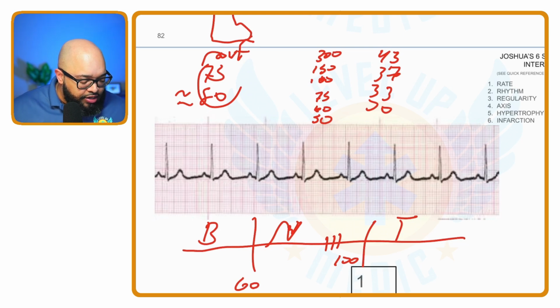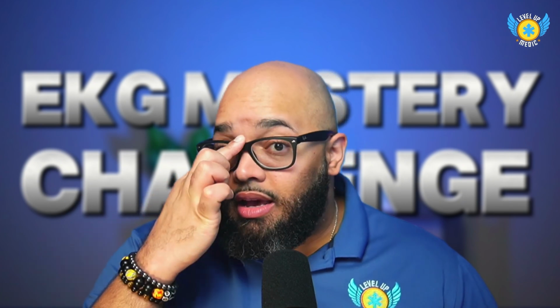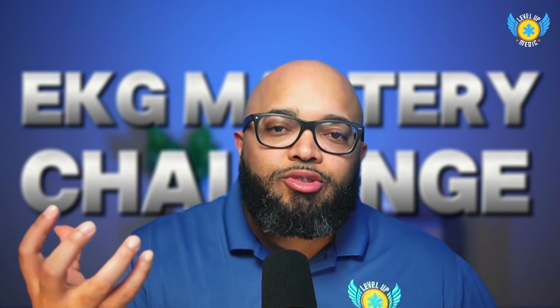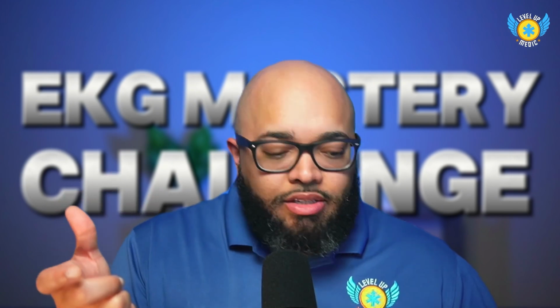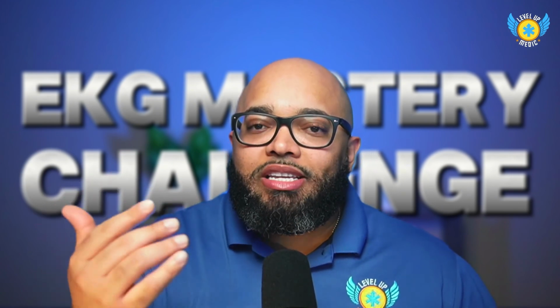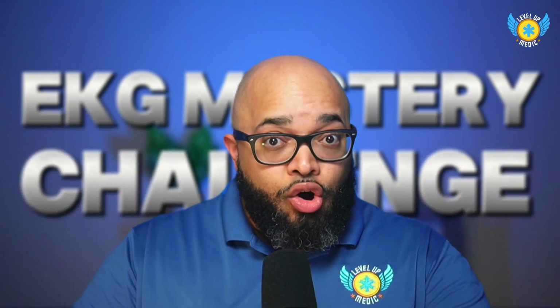The QT interval is, of course, from the start of the Q to the end of the T. So here, this QT interval is that distance apart. For the QT interval, there's a formula that you can use to calculate it, Bazett's formula. Of course, we have to factor in the heart rate. As the heart rate speeds up, the QT interval gets shorter. As the heart rate slows down, the QT interval gets longer.